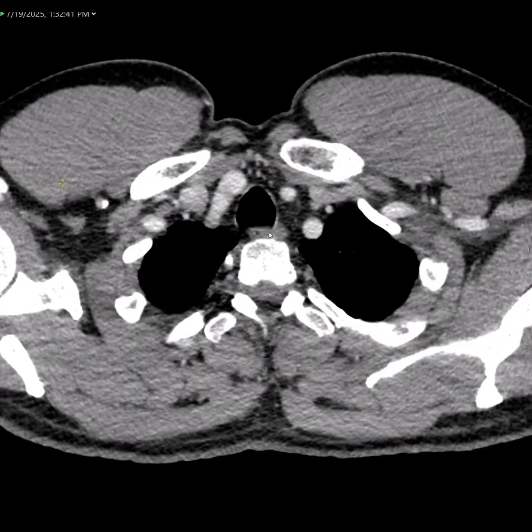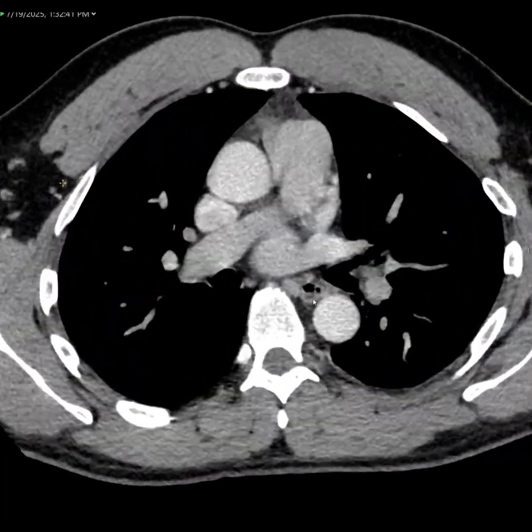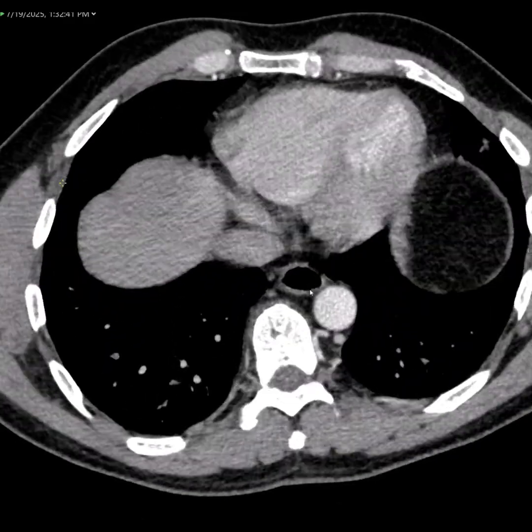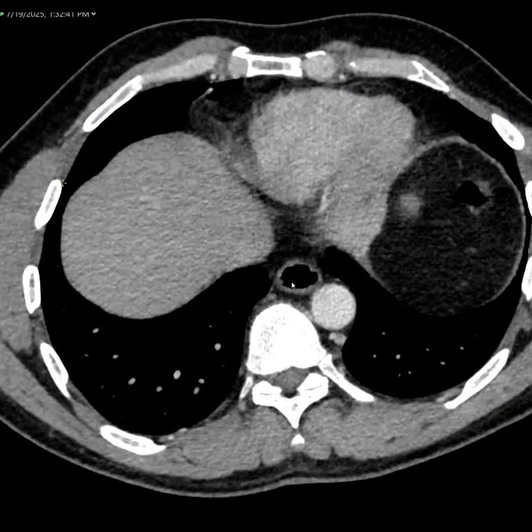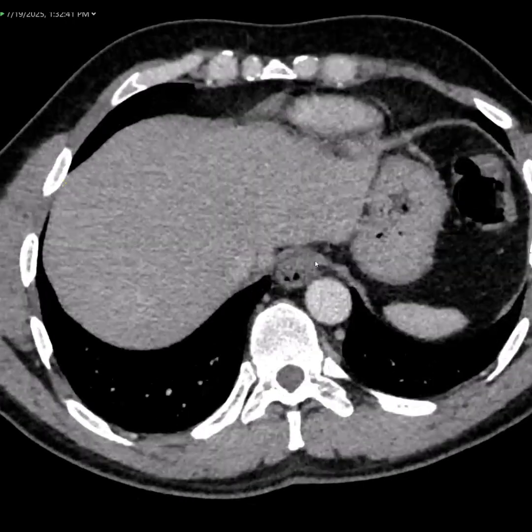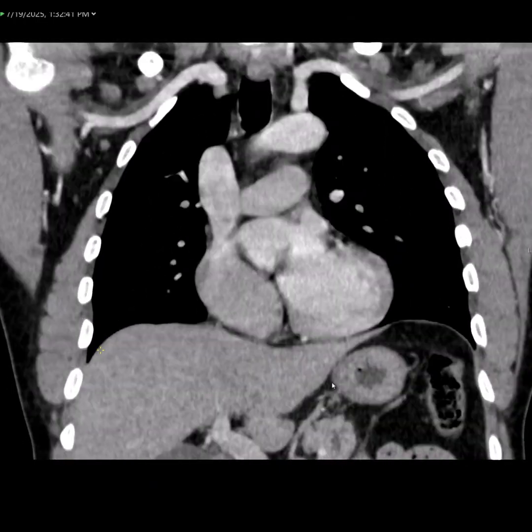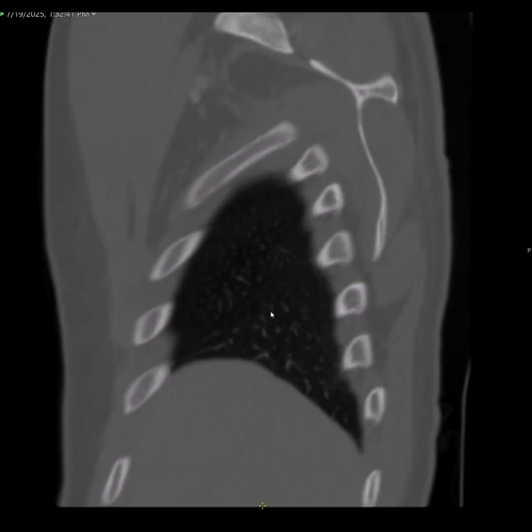From there, you can follow the contour of the esophagus down from the throat to the stomach, looking for any perforations or hiatal hernias. Here you do see a small hiatal hernia. You see the esophagus getting bigger before going through the diaphragm to the GE junction into the stomach. That little outpouching would be a hiatal hernia. You can also typically see them better on either a sagittal or coronal view. Here you can see that ballooning of the esophagus above the diaphragm, indicating a hiatal hernia.